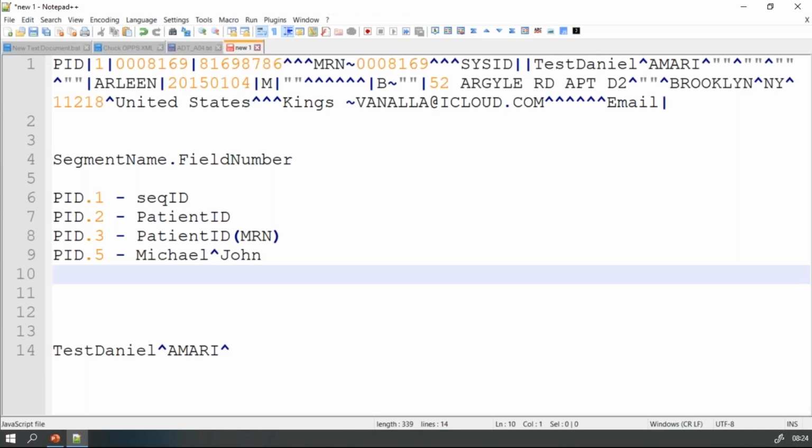So when we are extracting data from the database and building an HL7 message, we will keep in mind whether that schema is being complied with or not. We will comply with that schema and then build the specifications. Even after building the HL7 message, we will write transformation logic which will validate whether we are complying with the specification we have decided with the vendor or not. That is done in Mirth Connect. Thank you. You're welcome.